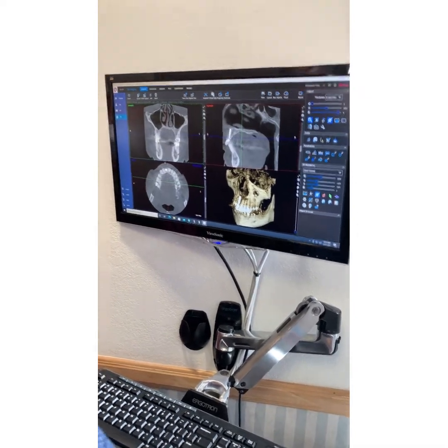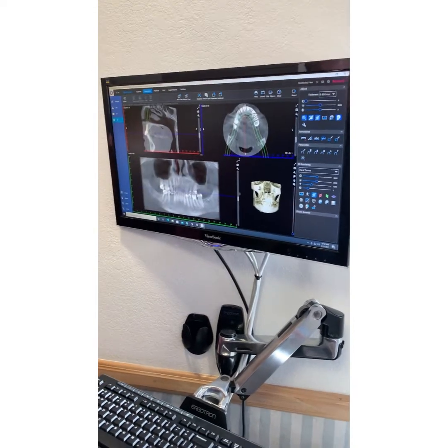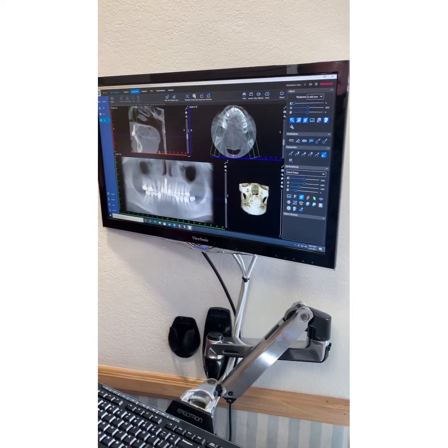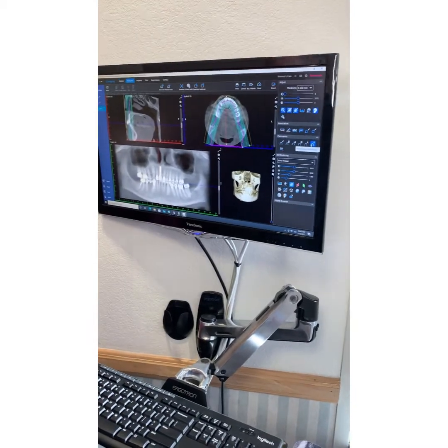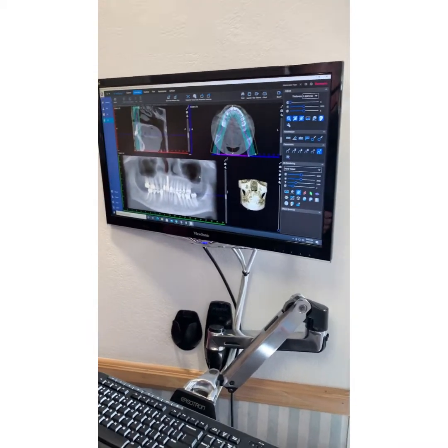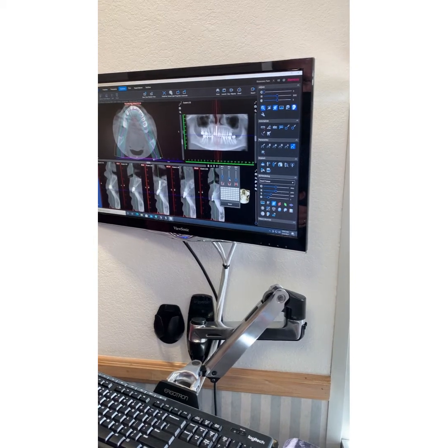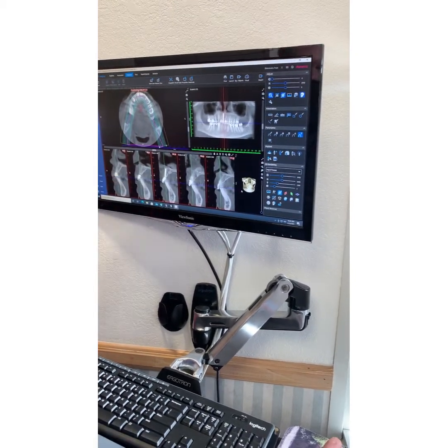But let's say you change stuff here. I came over here to where my occlusion is, and then I come over here and just let the computer try to design a decent pan for me, so I can see bone heights and get my canals. Look at that. How did you sharpen it up? That allows you to create a little pan here, and then when you move down the road to implants, you can start. I don't know what version of Romexis you were on before, but this looks a little different, but all these tools are the same.